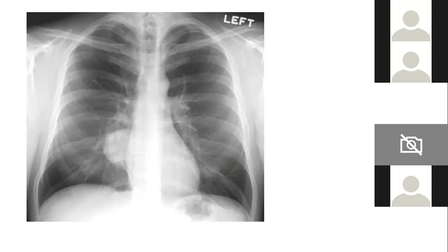We should know how to tell whether it's mediastinal versus pulmonary, and try to locate which mediastinum it may be in. Definitely this lesion is not in the anterior mediastinum, right? Everyone agrees to that. So why posterior? Why do you feel it's a posterior mediastinal lesion? Why not a middle mediastinal mass?